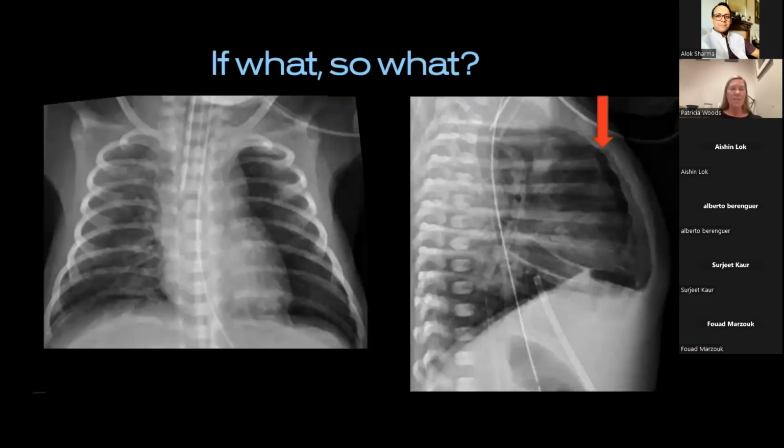All right, and this is the X-ray. Clearly, you've got a rim on that side. You'd obviously search hard and go, right, I'm interested in that right lower side of it now. With minor pneumothoraces, it's easy to get excited and jump up and down. Please just don't stick a needle in it immediately. Okay, just assess it, put it in context.